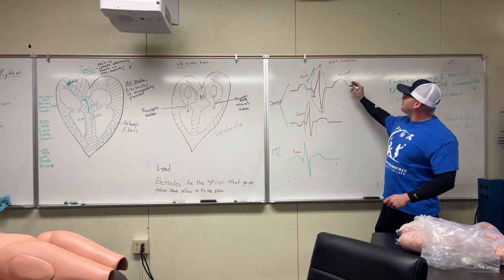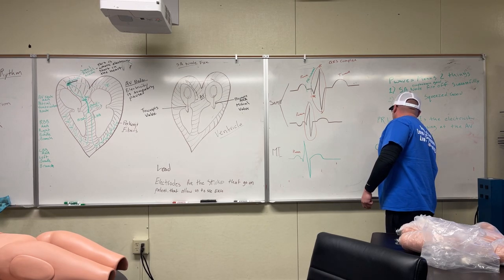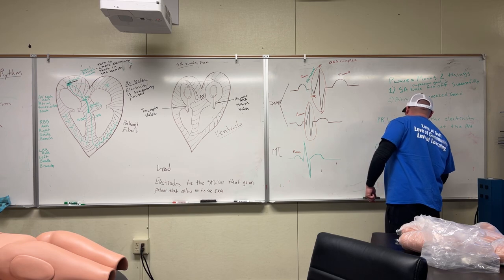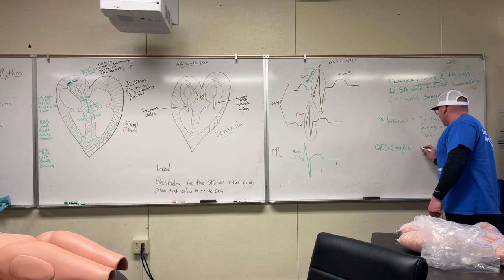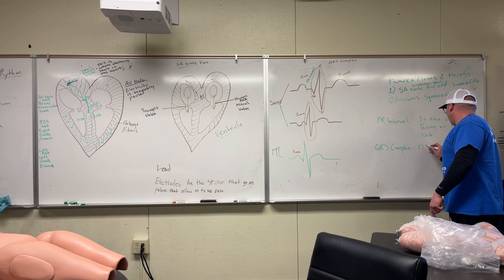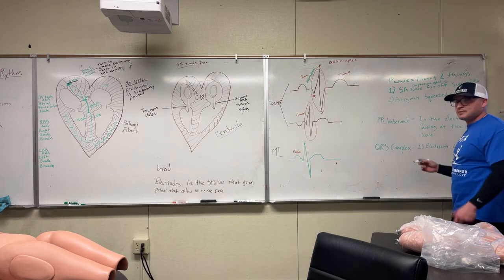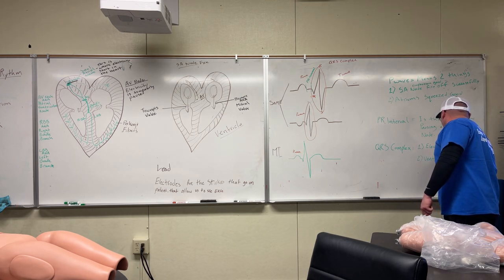And the T wave, so actually I'll put this QRS complex. I know it's fast, guys, my bad. We'll review it on Wednesday. Means two things. One, I'll just say electricity left the AV node, and two, ventricles are squeezing.